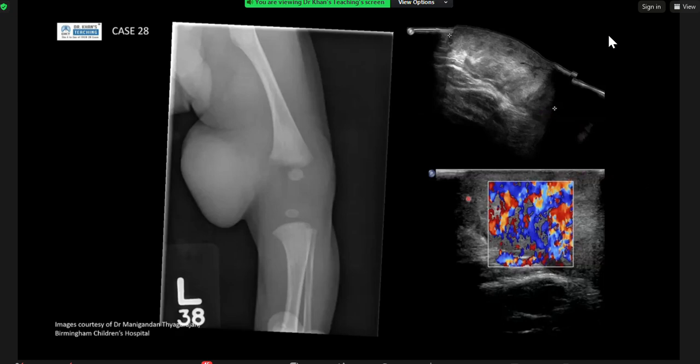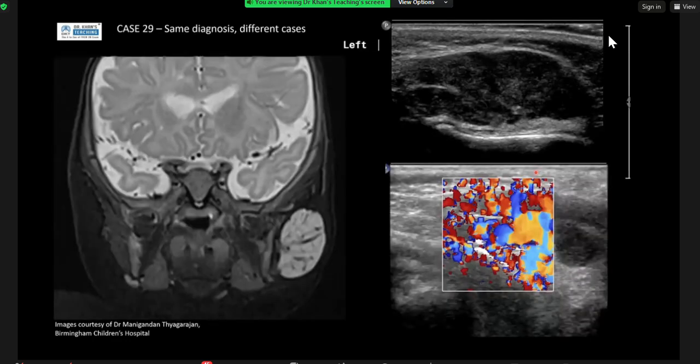And the key thing is that with hemangiomas, they're often very richly vascular. They can happen in the limbs. They can also happen in faces. I think you mentioned this might be parotid. Good thought. The only thing here is that I think this is a fairly well-centered coronal view. If it was parotid, you should be able to see the other parotid on the other side. I'm not sure you can see it here. But this is just an example to show craniofacial hemangioma.